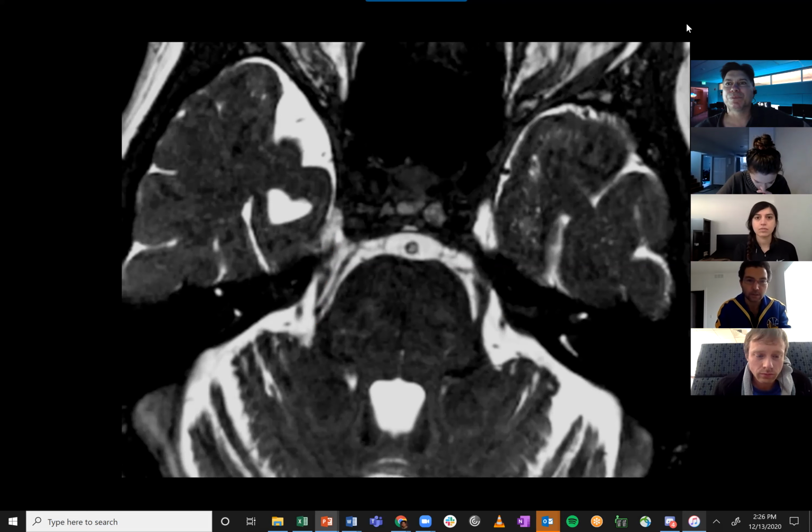Okay, thank you. Dr. Quickens, a quick question. Is there an abnormal cystic structure in the right mesotemporal lobe? Yeah. I think you may just be volume averaging through a sulcus over there. So I think that's just a sulcus. It's unrelated. Okay, good. Thank you.